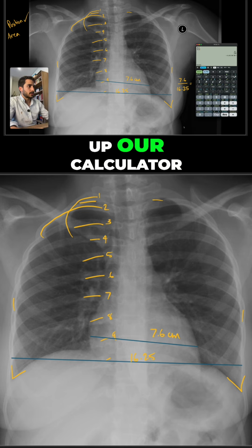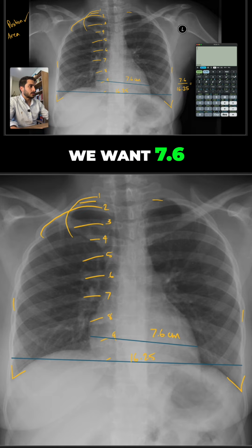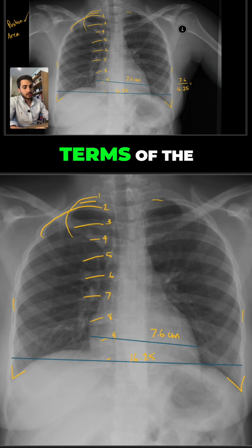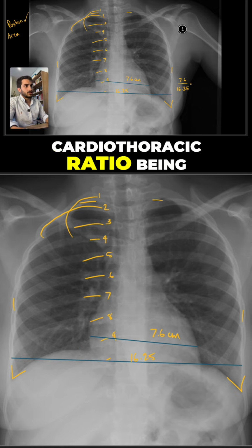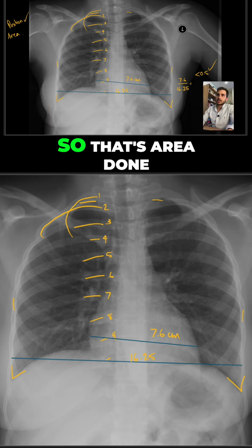Okay, so if we bring up our calculator, clear that. We want 7.6 divided by 16.25. Okay, so that's about 0.46, under the 0.5, so quite good in terms of the cardiothoracic ratio being less than 0.5. Okay, so that's area done.